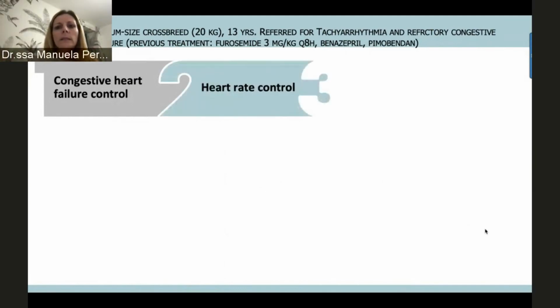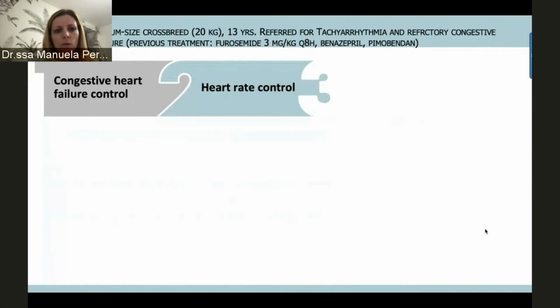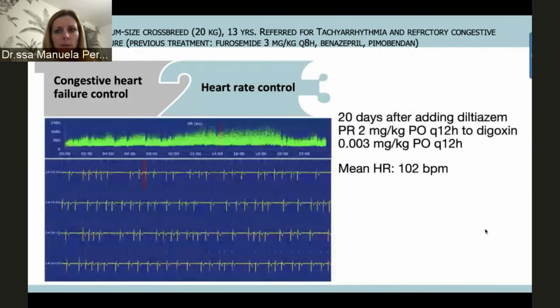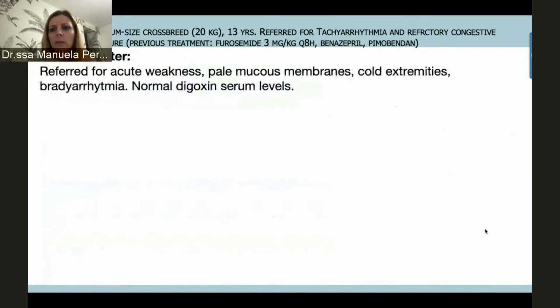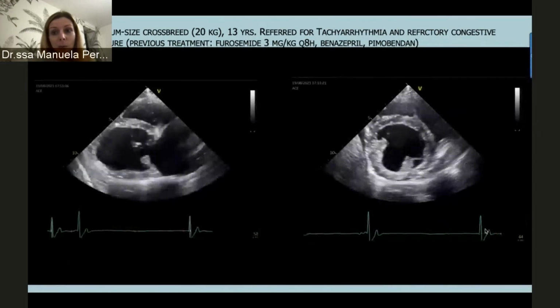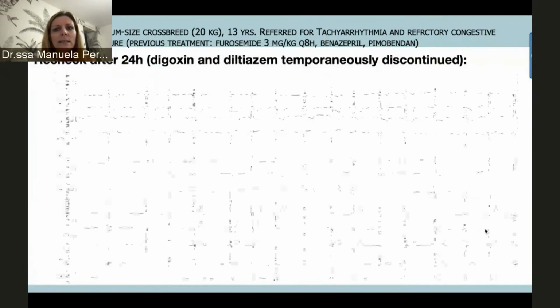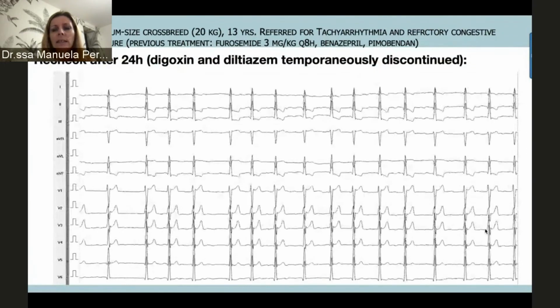Okay, now we need to review the overreactivity of the vagus nerve on the sinus node, because we have two questions about that case. The first question, by Sandra Grekenbauer, is, do you think that the exercise intolerance is not caused by the functional AV block?